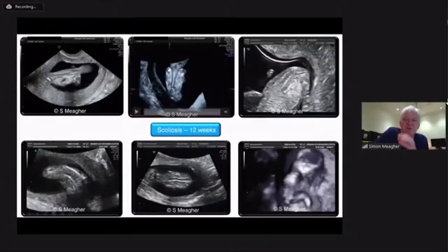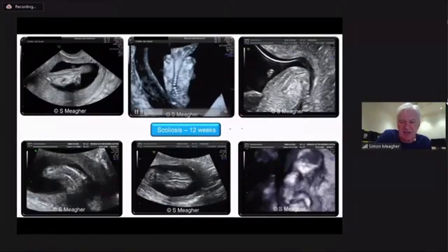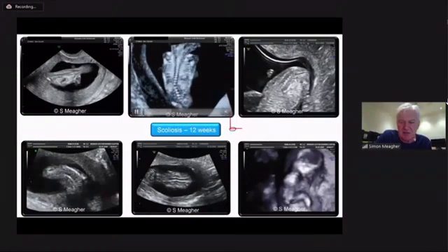So if you routinely look at the vertebral bodies, and the way of looking at the spine is to divide it into halves. Essentially, what you're looking for is the blocks of the vertebrae, and in the different coronal plane are the transverse processes.